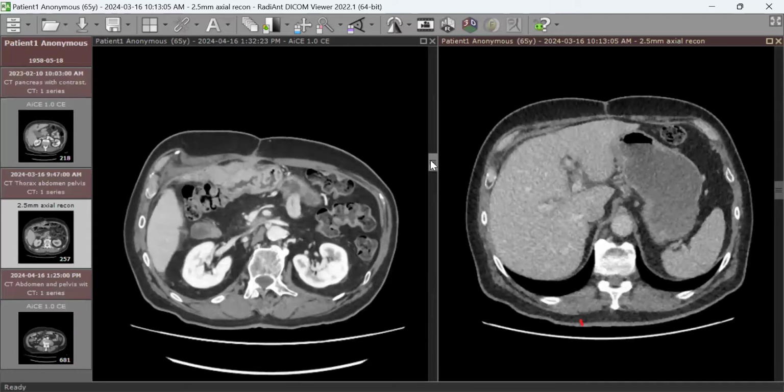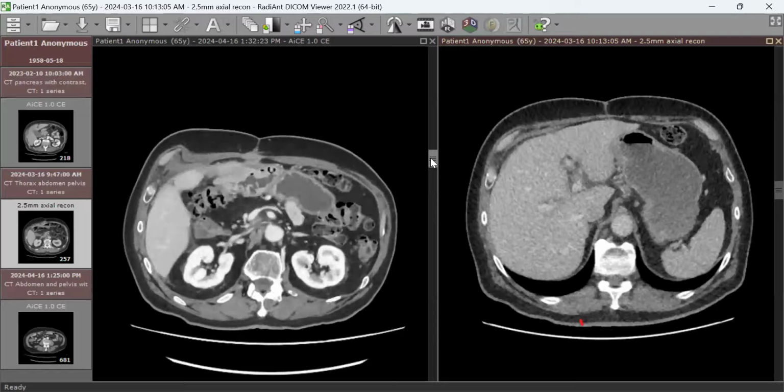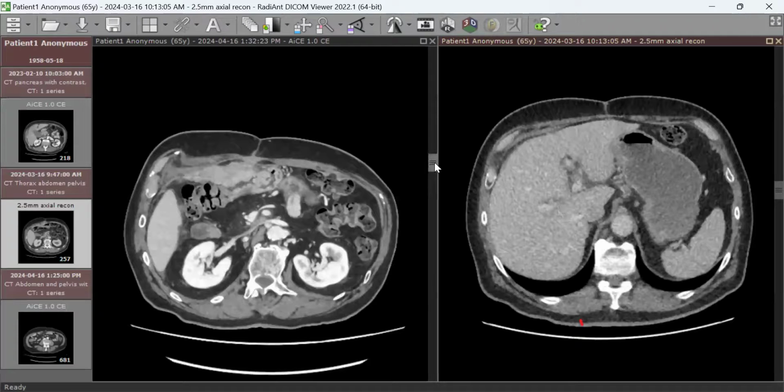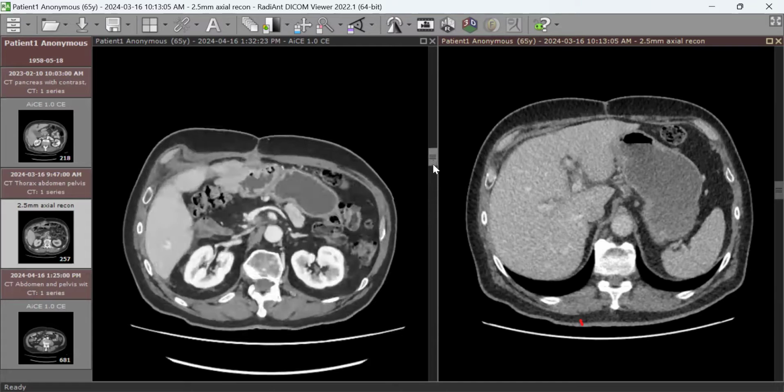Yes, definitely. Of course, we always expect a narrowing at the site of anastomosis. That's number one, as you mentioned, sir. In addition to that, we can see the metastatic process involving the area.